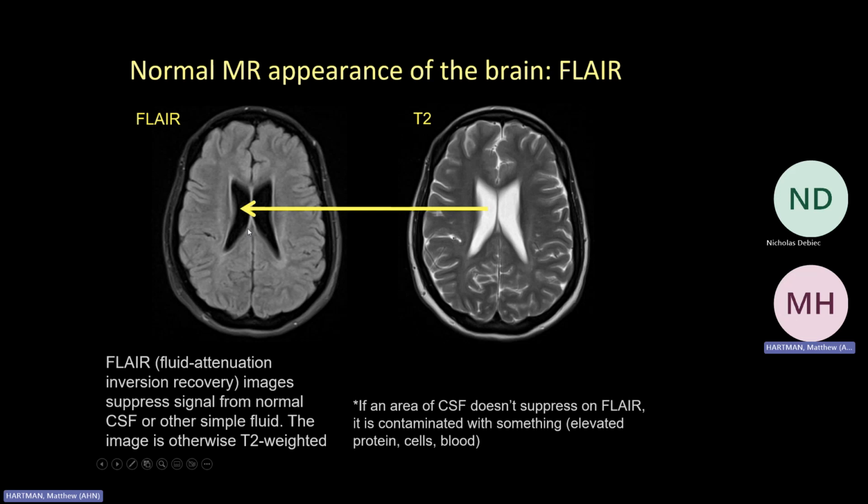A couple of ways that you can identify this as a FLAIR. Again, this is sort of advanced med student, beginning resident level material, but I want to throw it out there because there are a couple tricks. I always look at the vents. You see it's a little bit bright around them. That's how I tell it's a FLAIR.